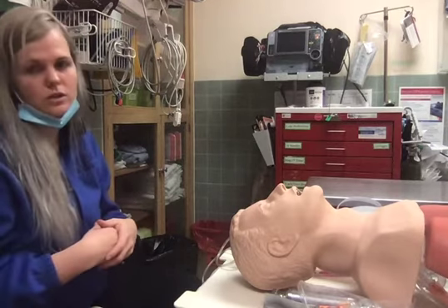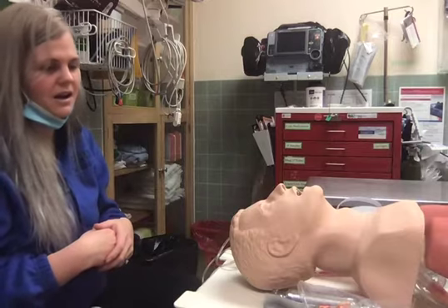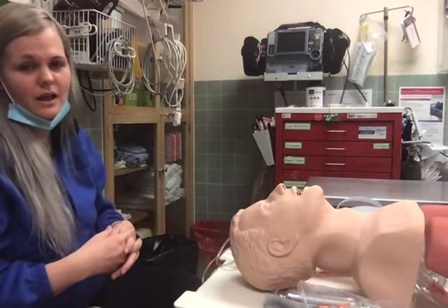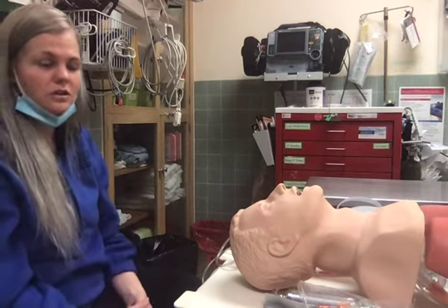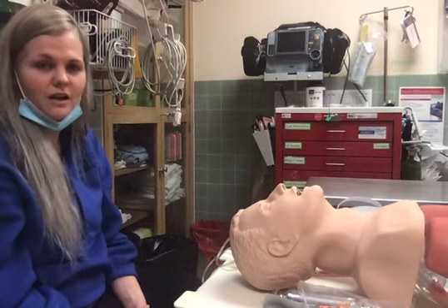You do have your rescue airway, if you would call it that, of a cric, which I'm not going to go through today, just due to the fact that I wanted to keep this fairly basic. And then we also discussed two types of ventilation that you would see on an actual ventilator that you could utilize for patients in respiratory distress.